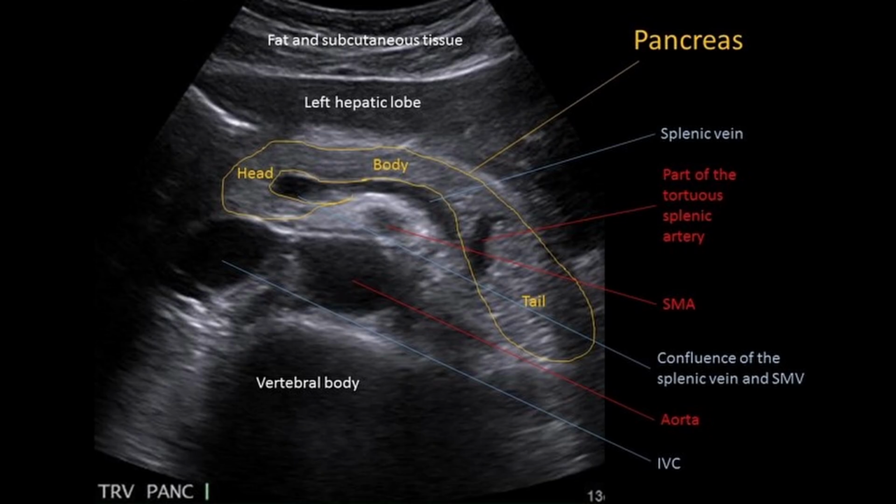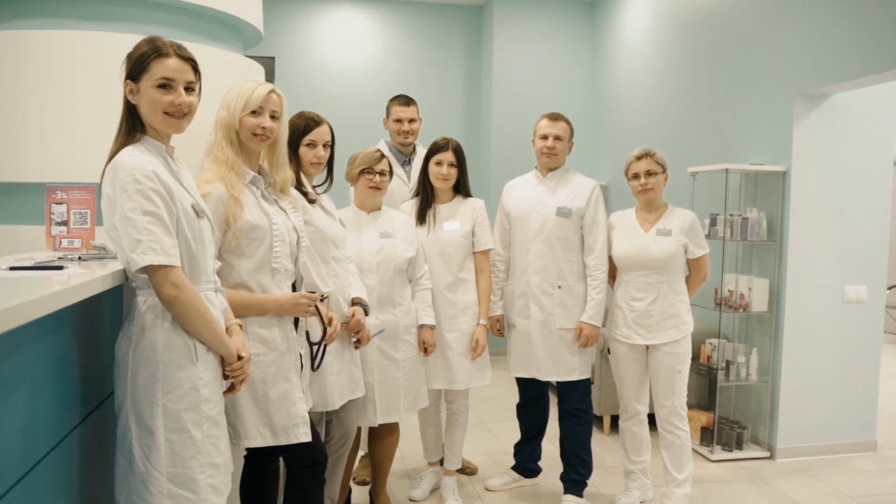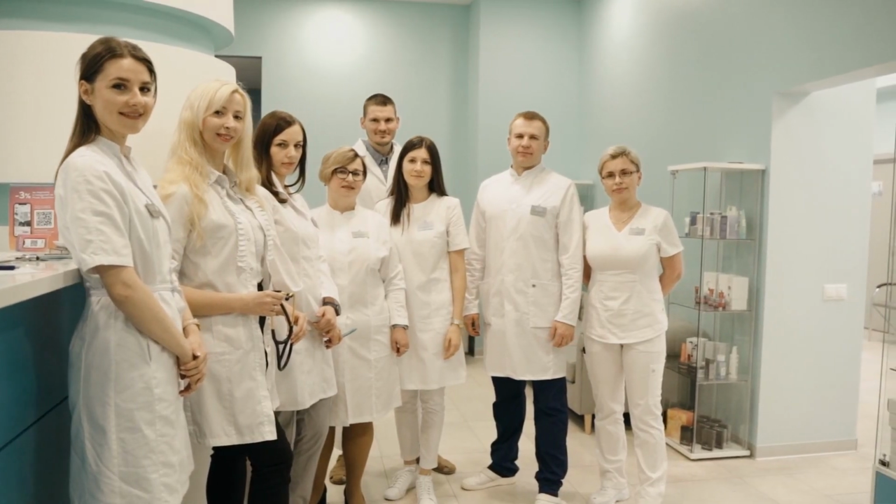The pancreas is a bit of a hide-and-seek champion. It's tucked way back there. When you do find it, it should look pretty even. If it's big or has dark patches, that could mean pancreatitis, which isn't very fun. And if you see a mass, it's time to call in the experts. Lastly, the spleen, which is like the liver's slightly darker twin. If it's too big or has some weird spots, that could be a sign of infection or something else. So there you have it, the abdominal tour. Ready for the next stop?